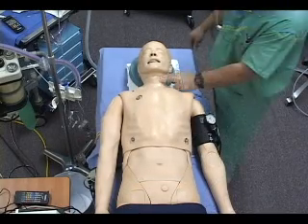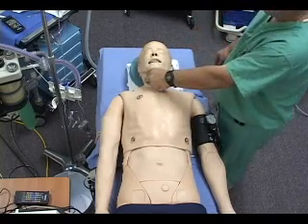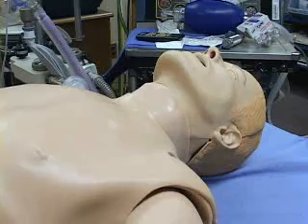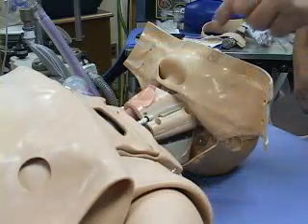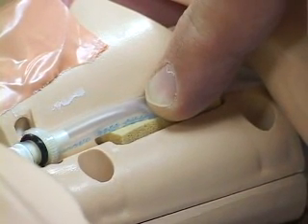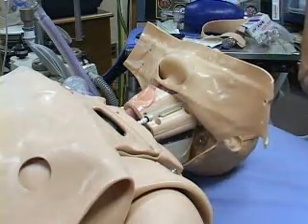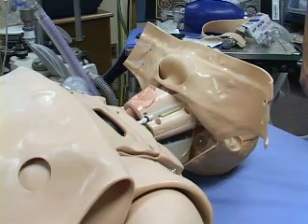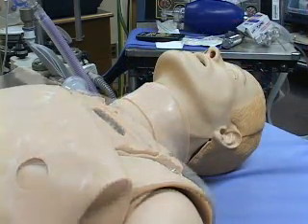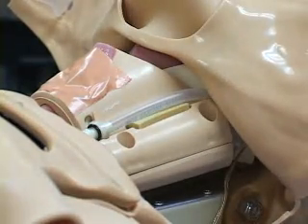In contrast, the carotid pulses are pneumatically actuated and have an entirely different feel. These pulses are activated only when palpated. As seen in the phantom view, the carotid pulses are actuated when a switch under each artery is depressed. They require a more deliberate and aggressive approach to actuate, since not only must the switch be depressed, but there are 2 layers of skin lying above the carotid arteries as well. 5 seconds after removing the palpating finger, the carotid pulses will disappear.